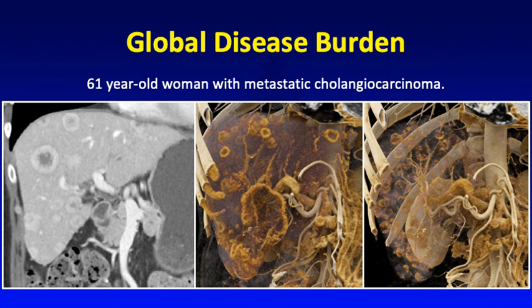And this is another rendering, making the liver even more transparent so you can see through the whole volume of liver to appreciate how many mets there are. And I think these more lifelike and realistic depictions can be very helpful in communicating the disease status with patients.